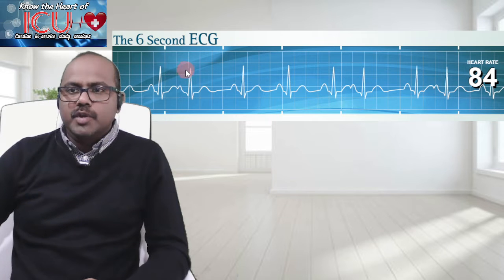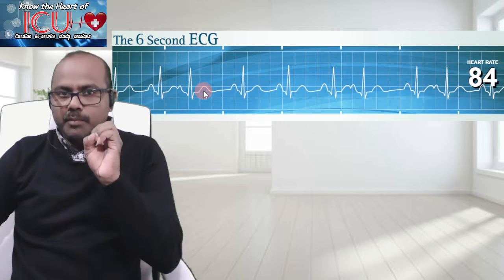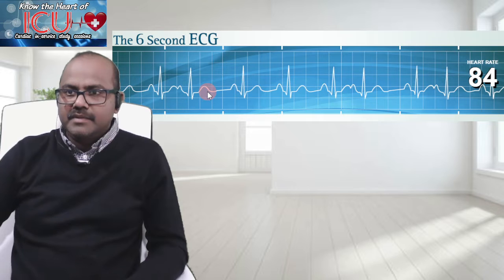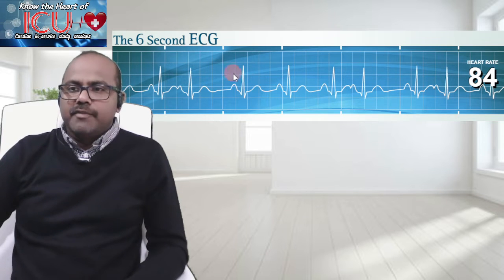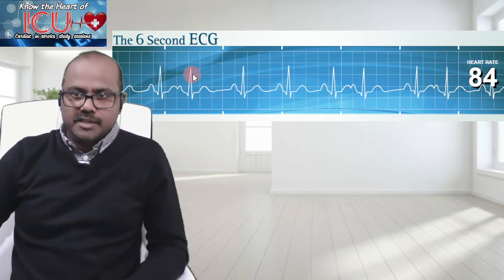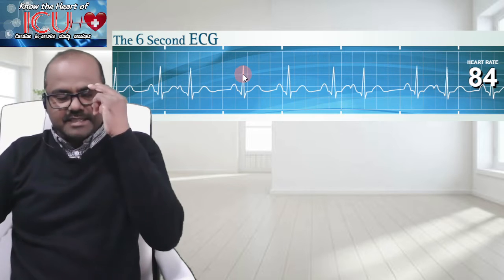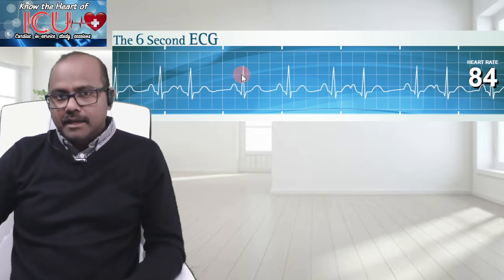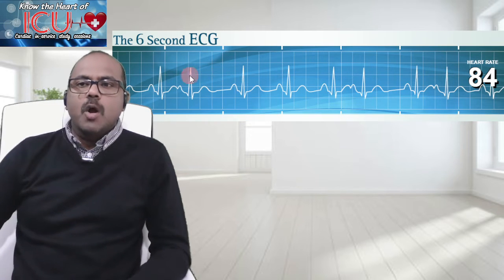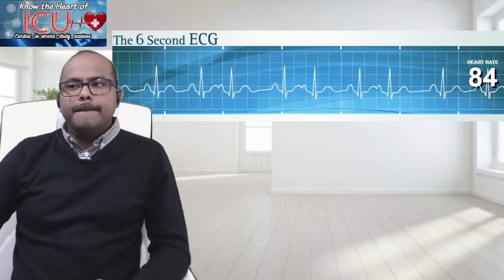So there's a narrow RR interval. And the SA node will be silent at this stage. It won't produce an impulse because depolarization is already happening in the ventricle. And the SA node will fire at the next regular interval. That's why you have a shorter RR interval followed by a longer RR interval. That's a classic sign of a premature atrial complex, or any premature complex. That is called the compensatory pause. So that's your PAC. Now you know how to recognize your PAC.